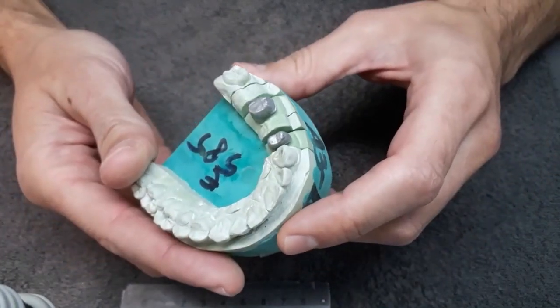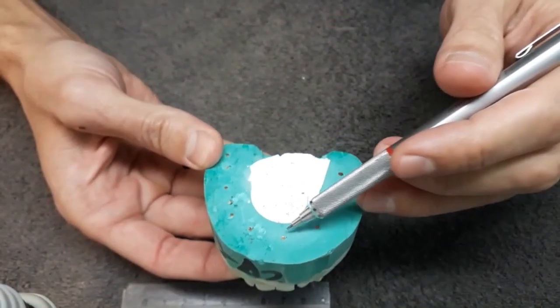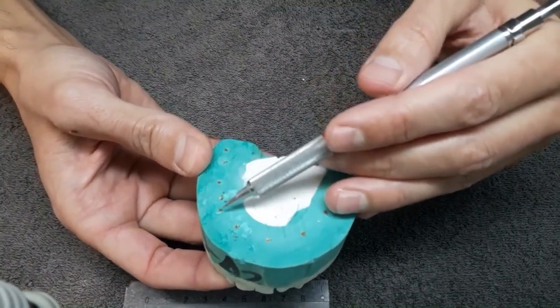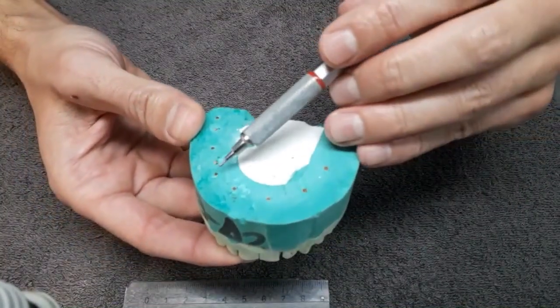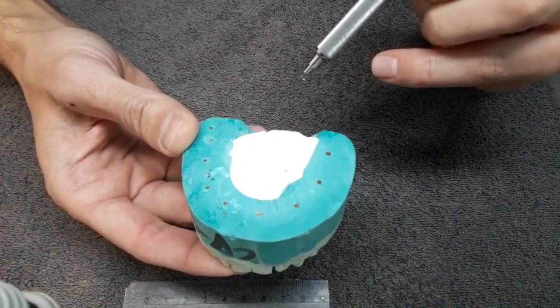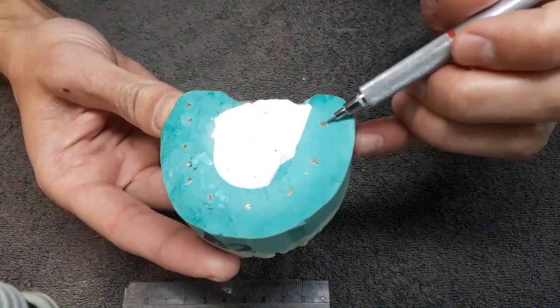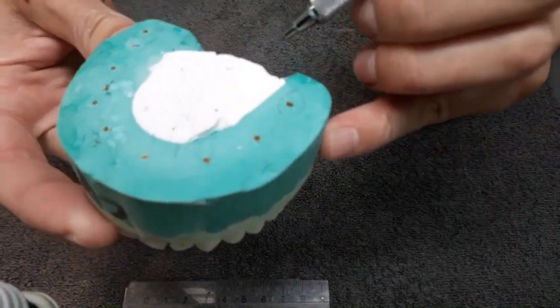the base. And on the back of the base, we see those places where we can press up the pin in order to remove the die from the base of the model. This level of all this was done by trimming after the model has been cast.